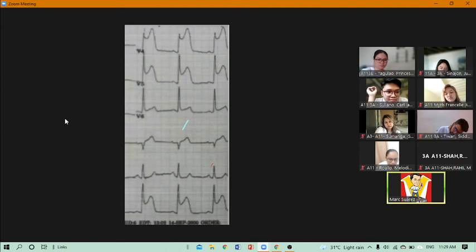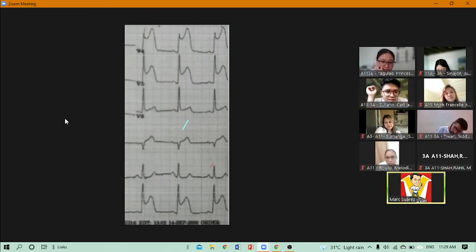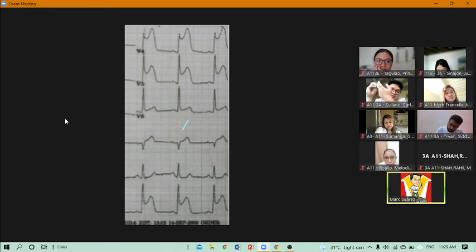How about V5? Elevated. V6? Slight. Okay, V6 is this one. Just follow the line. There's a line here. Slight lang.